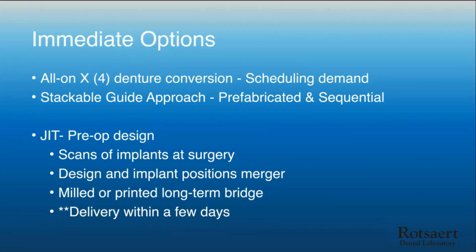The other one is stackable guides, and that guide approach. I'll show you an example a little bit later. This is where everything is pre-done, and essentially we've printed out all these various jigs to be able to do the surgery, and then click on a jig holding a bridge. And again, you can do that pickup just like you saw earlier with that temporary bridge.